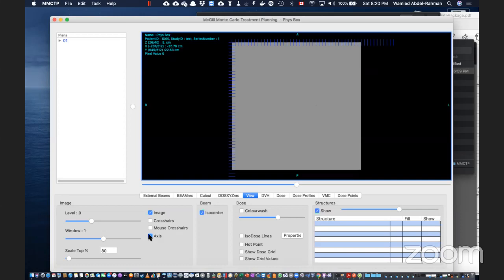So the crosshair where those two coordinates meet is the border. Okay. So the crosshair is for the images, how they translate from one view to another. Yes.